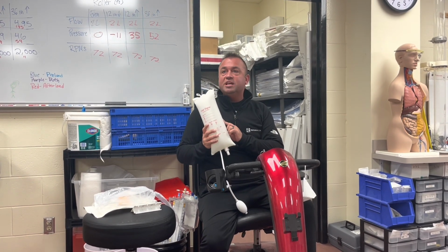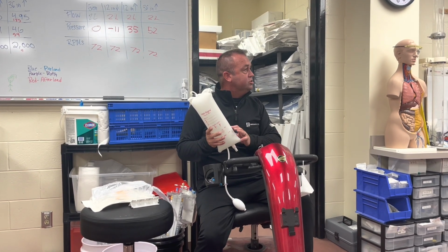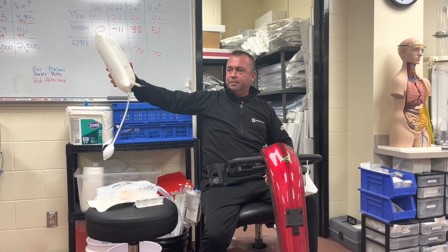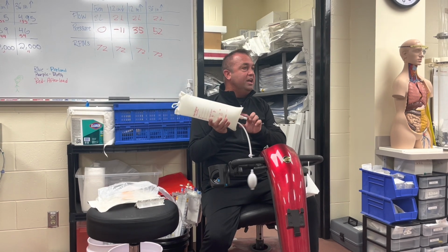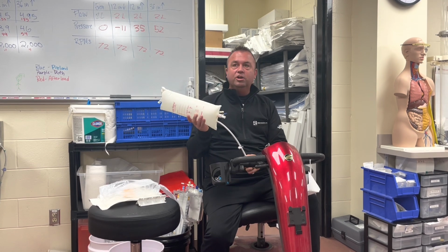We also have this when we set up the balloon pump, right? We have one of these transducers for the balloon pump. We have to set up a single transducer for our balloon pump to measure pressure the same way. So you can look at your balloon pump and see, oh yeah, we're still in the good. We're not in the red, we're still in the good, which is 300, give or take 40 or 50 either way, still are in the green.